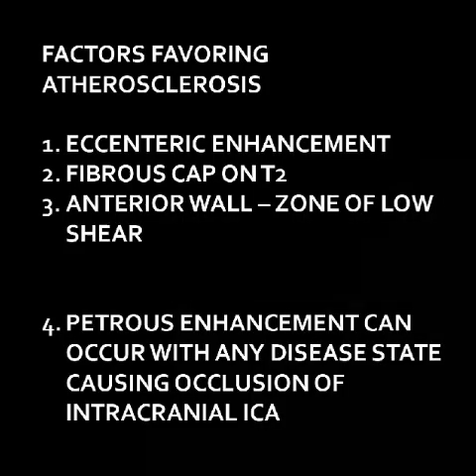Whenever there is ICA occlusion, the vasa vasorum can proliferate in the extracranial ICA, and enhancement in this segment does not contribute to the diagnosis. One cannot call it vasculitis based on this.